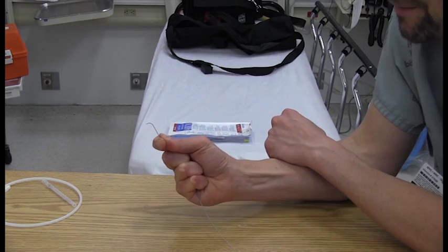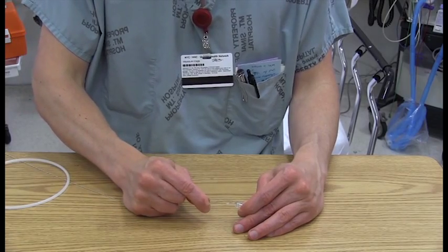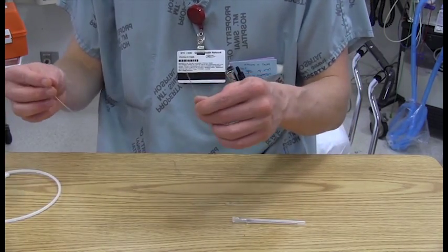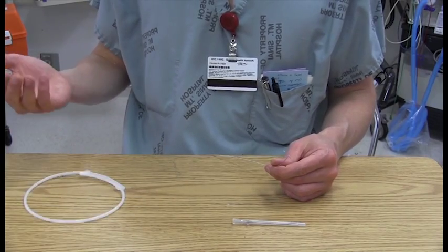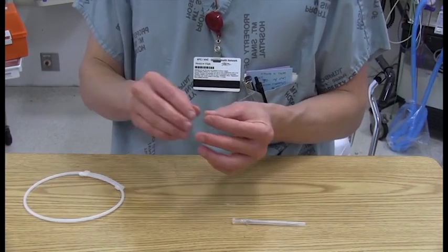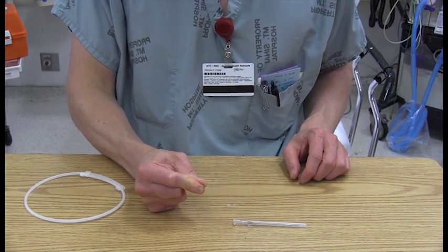And now this is nice if you lose that blue thing. You have your hub there and you've lost your blue thing. Well, oh, no problem. I got a straight wire right there that now I could advance. And in some kits, it's actually easier to just take the whole wire out of this holder, especially like when I'm doing femoral A lines. I just want the wire free. I don't want it in anything. It's a manageable length that I could handle it. And sometimes that blue thing gets lost. So learning this micro skill of wire straightening, I think, is very important.